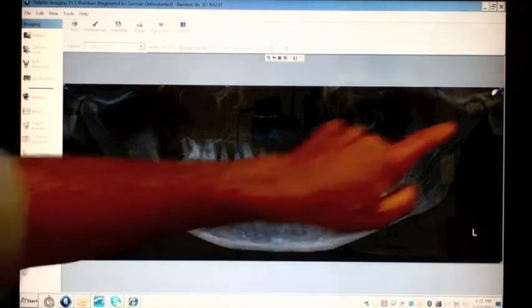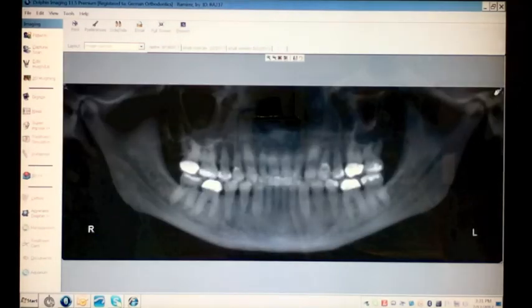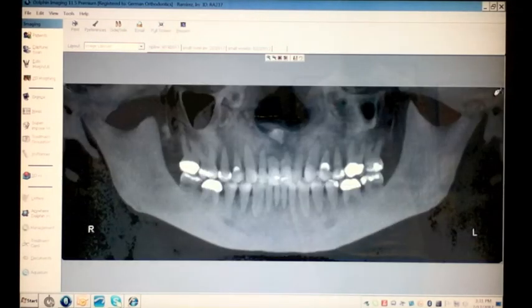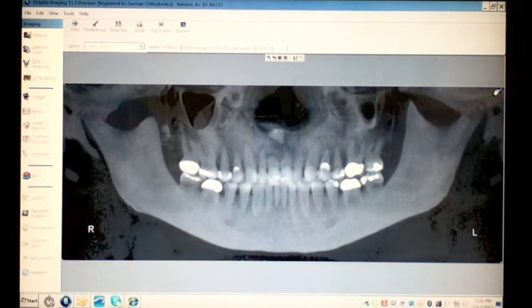You can click on the blue circle in the upper right corner to alter the appearance of the image to try and further diagnose from the panoramic image. In this view, you can get a sense that there is some pathology within the palate, right here. This view also gives a hint as to the short root on tooth number 8.